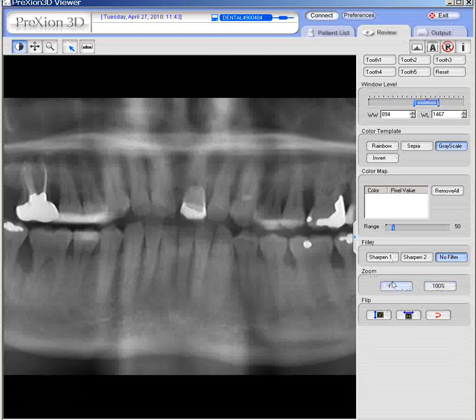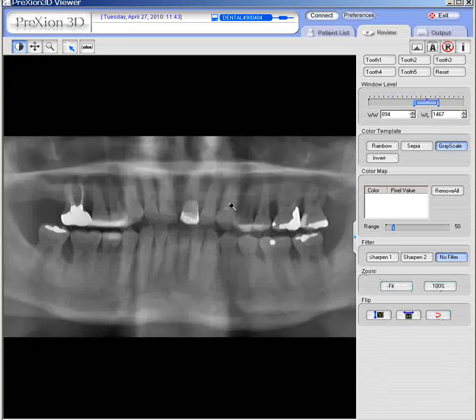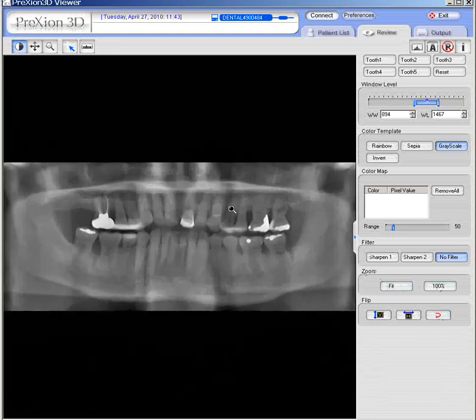To reset it, you can hit fit, or just go back to the resizing here. This is your reset key if you wish. Now, to zoom it again, just using the mouse, you know that as holding the middle wheel of the trackball down, press it down, and just move the mouse up and down or north and south.